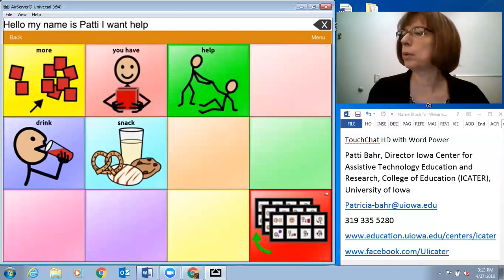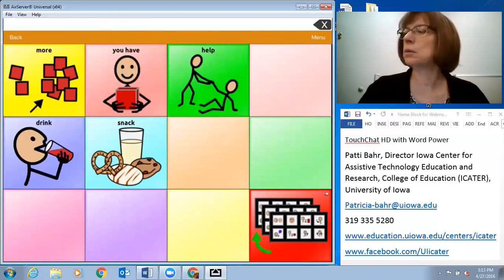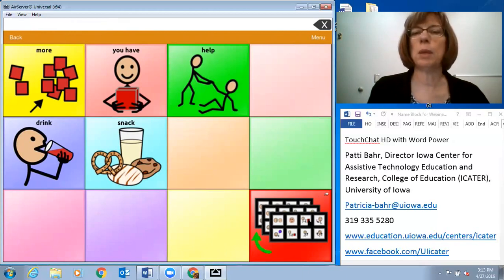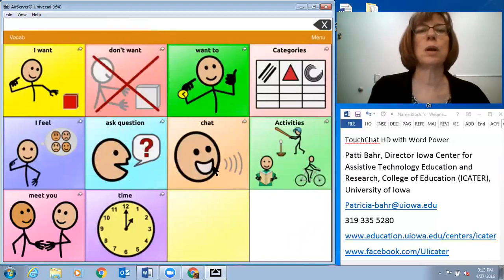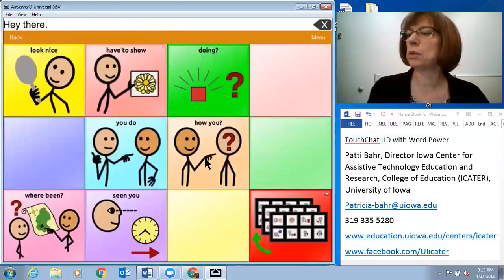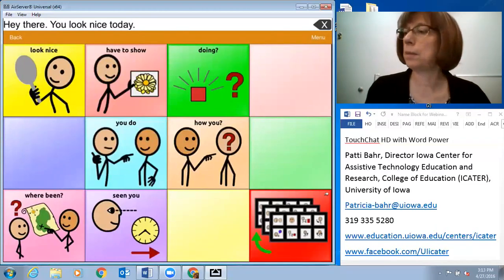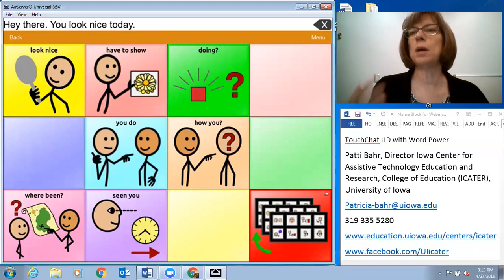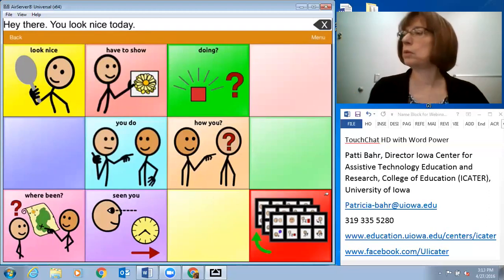I want help, and I'm going to delete everything that I've got up there right now. Go back to my main page, or go back a page. These would be things I can chat about. This one, you look nice. Hey there, you look nice today. And these are ones that, because it's not a novel utterance, you could record a voice in this one.